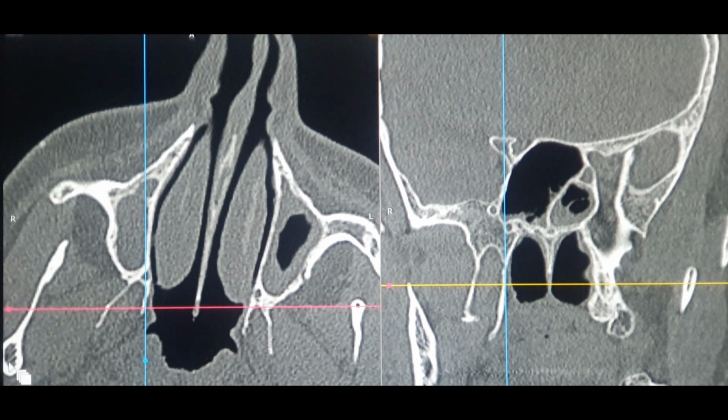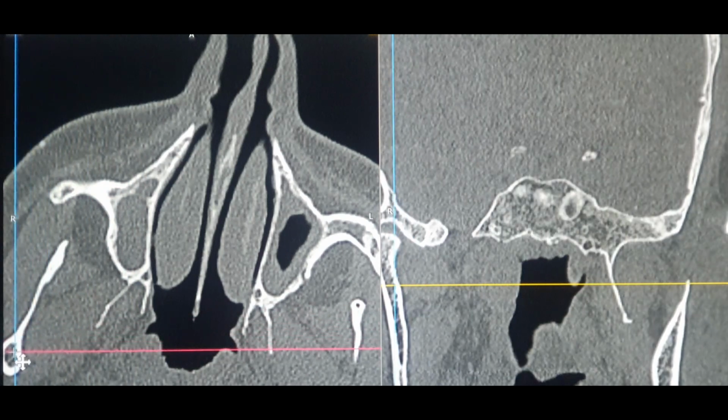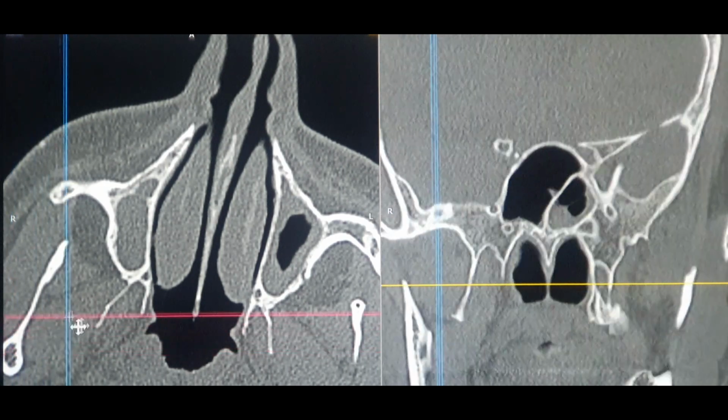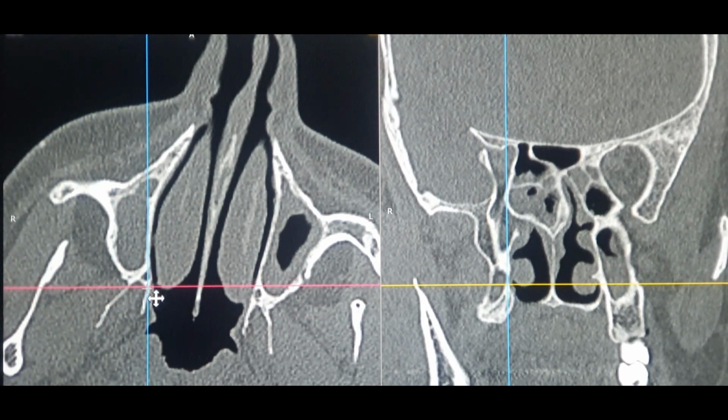This becomes the lateral jawline, the temporal bone area and all that. I'll just show you that here somewhere. If I keep this cursor over here, this becomes the jawbone. That becomes the area where the mandible fixes inside. Okay, so this is how you can study the area. So that's the medial pterygoid plate.